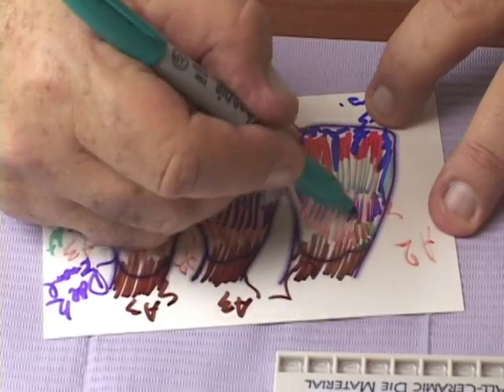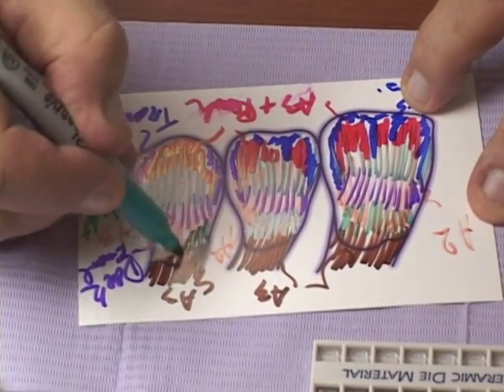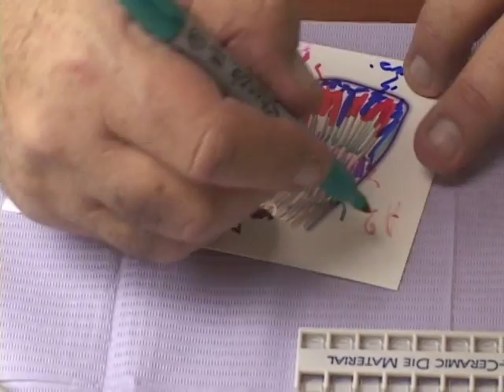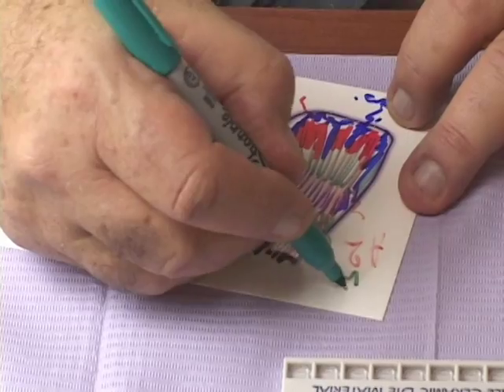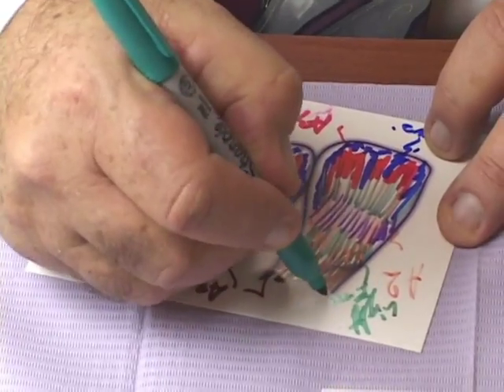And at the height of contour of each tooth, we often see that the enamel has a thicker enamel zone in those areas. And we mark it again with a white enamel, but we want to elevate the brightness or the value. So we will say that it's a light enamel plus white.